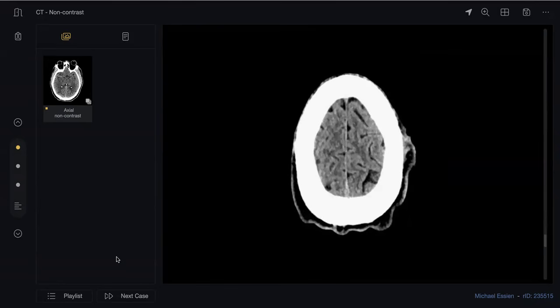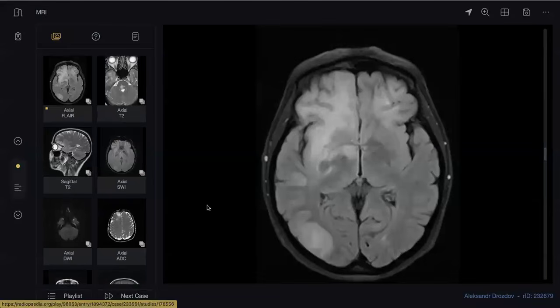Do we have the next candidate? Yes, hello. So this is your case. Start describing. What do you see? Shall I ask for control or just describe this image? No, ask for control. I requested control. Given. So I'm presented by, it's not scrolling, sorry, one minute.